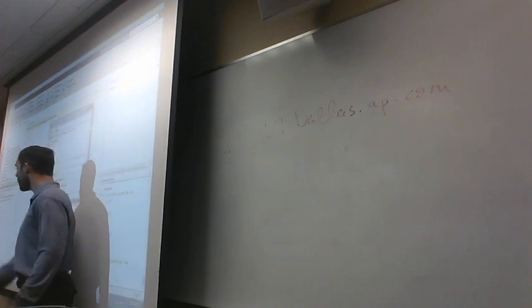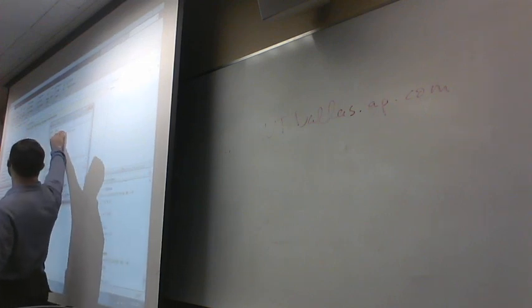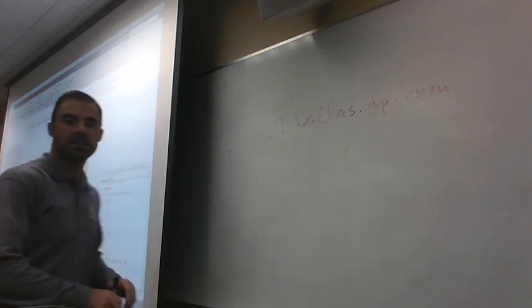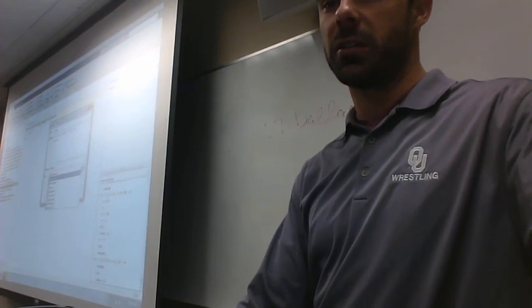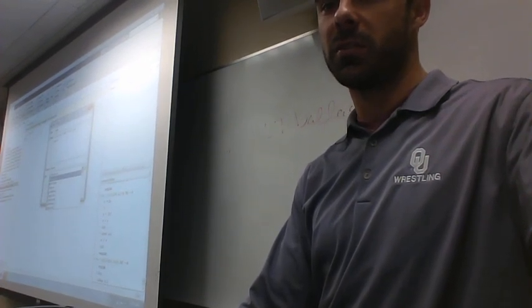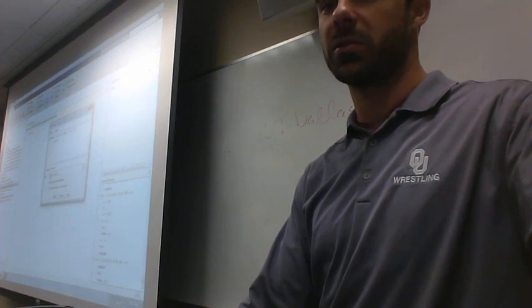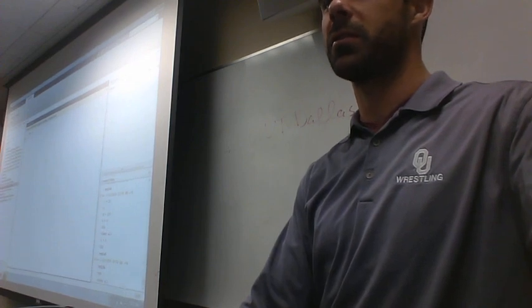And we'll talk about that as the class goes on. You can write big, long code and just be able to hit it once. We'll get to that later. And I wonder if we can change the icon. Let's make it a little MATLAB icon, just so it's nice and colorful. Hit save. Okay, so now that's up there.